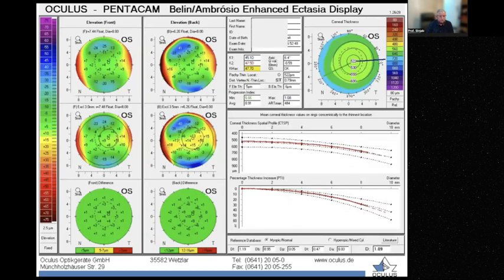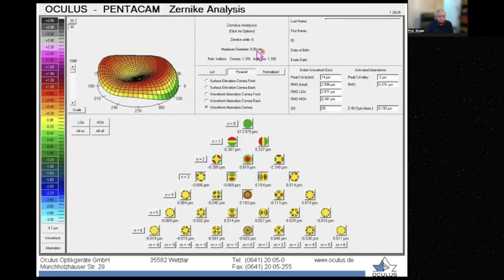Okay, the same here, nothing, consistent, less than 1.2. All parameters are okay. Zernike analysis, it should be 6 millimeter. This one, all of N3, center of N4, RMS is 0.274, so nothing. Z40, almost nothing. And by the way, the cutoff values for the RMS of those 5, as we mentioned, 0.35, 0.5, and for every individual one, the same.